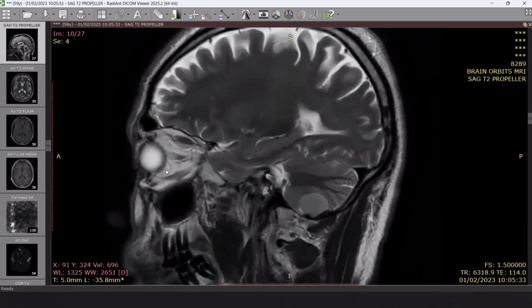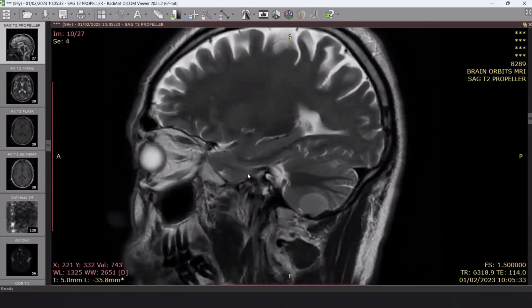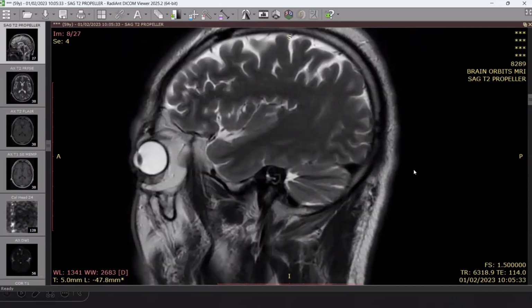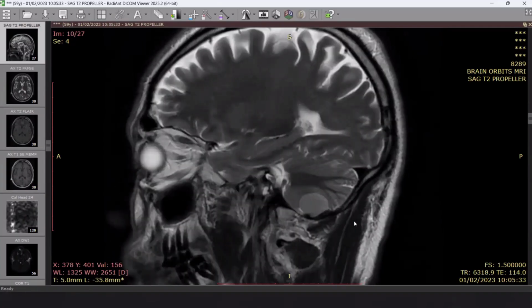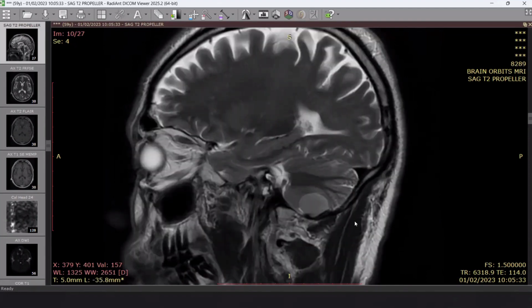I want to localize or focus here, please. Is it intra-axial or extra-axial? Sir, I know that the location is very difficult and odd, it's not common, but let us think together. If I see other features, as it is compressing the brain parenchyma, it seems that it is extra-axial, I guess. Yes, I agree.